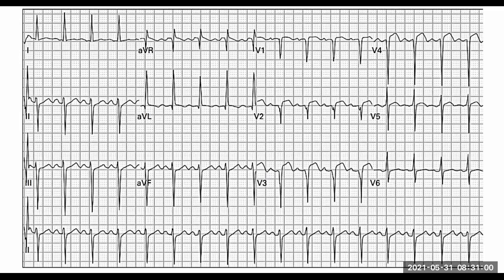Let's concentrate more on the infarct side of it. So we know in V1 and V2 we've got ST elevation. So that tells us something's happening in the septum. All right. And let's go to V3 and V4. So V3 and V4 are looking at the anterior part of the heart. Okay. So what do we see in V3 and V4? What's happening there? ST. Very good. ST elevation.